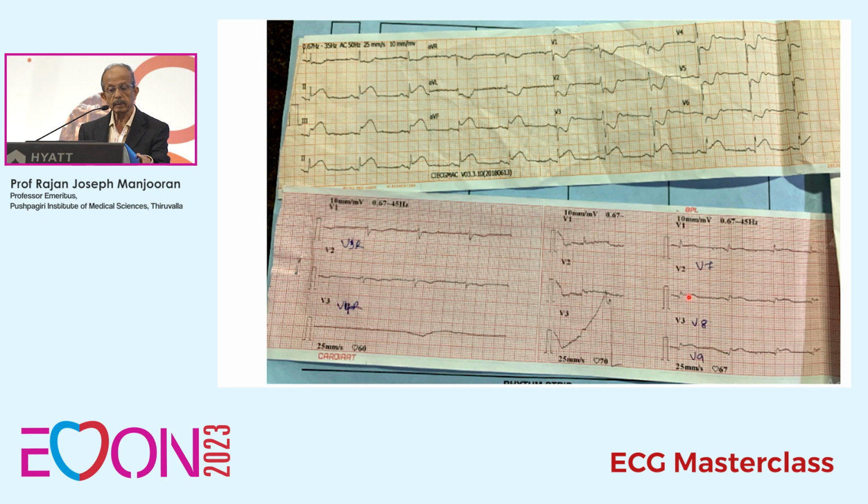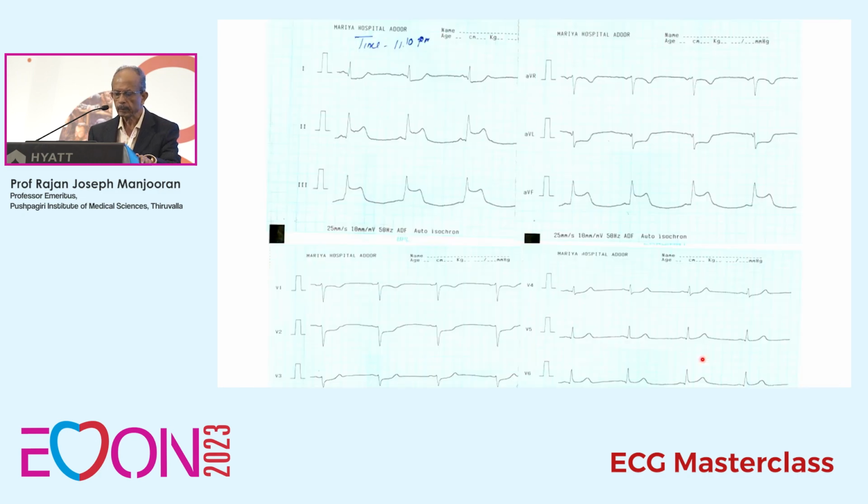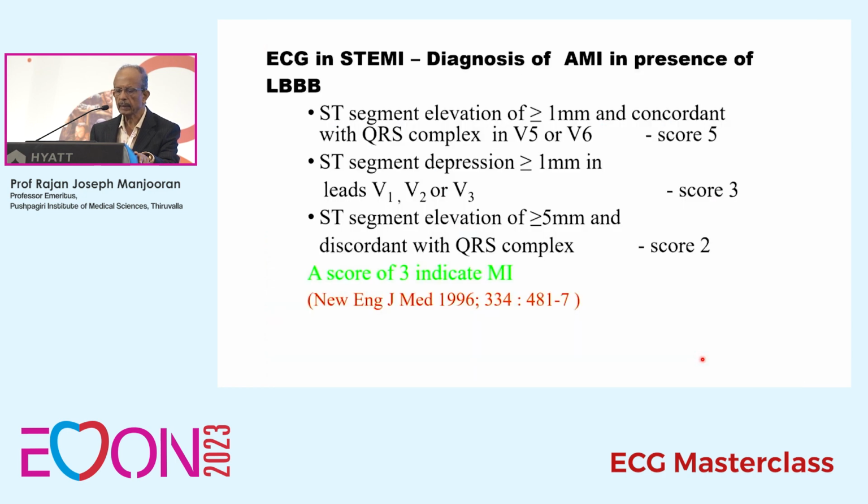And this type of electrocardiogram can be either due to a circumflex artery involvement or maybe a large RCA also. So in patients with posterior wall myocardial infarction, you must always think about the possibility of a circumflex artery involvement. It also is another inferior myocardial infarction. So we'll go to the next slide.